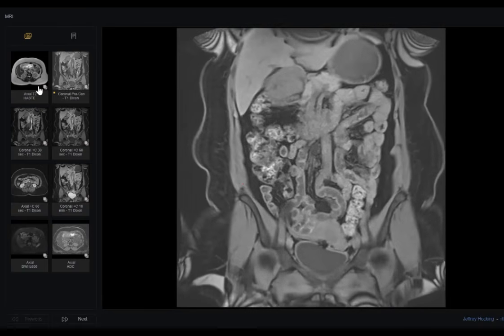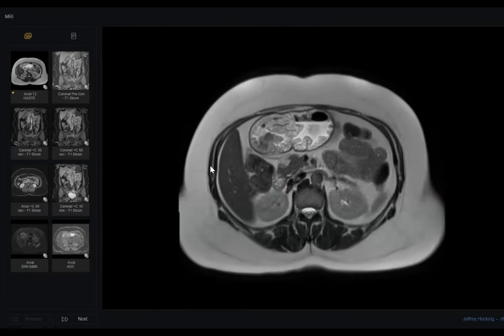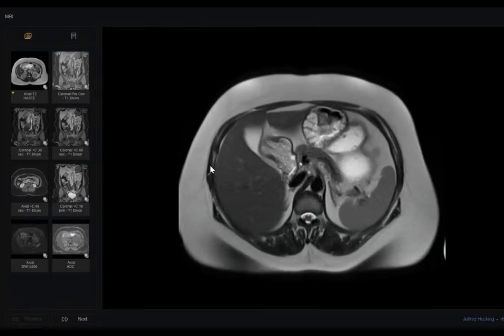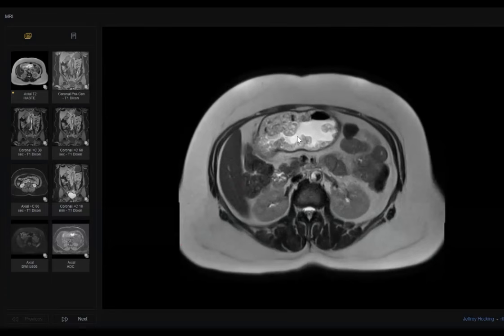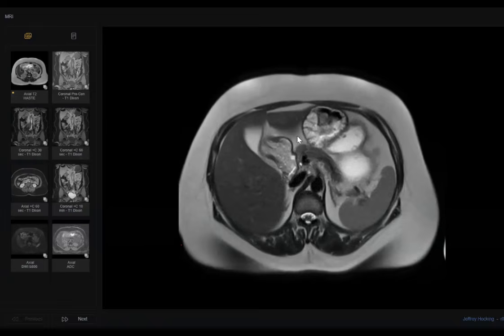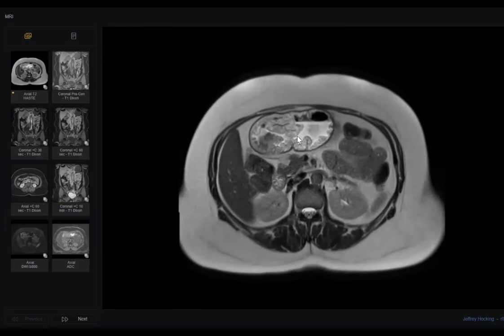Could be. Especially it looks benign. Why? Look, a very large granulated mass filling the pylorus and duodenum. Look at this black line. This is the serosa and the muscularis mucosa is not at all infiltrated. So it is a sign of benign lesion. So I must think number one about multiple adenomas or polyposis. At least I will tell the examiner it looks benign.